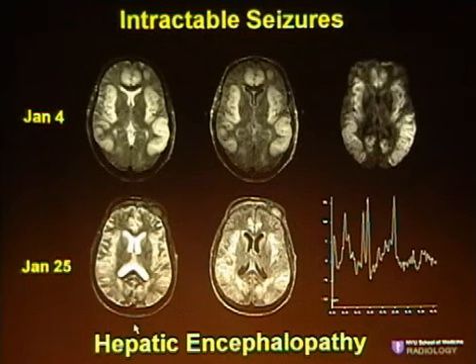And this is a fairly specific metabolic spectrum, and the reason for the changes are that you see some neuronal damage from the encephalopathy causing the NAA decrease. There's probably some damage to neurons which elevates the GLX peaks because of the abnormal metabolism and abnormal osmolality.